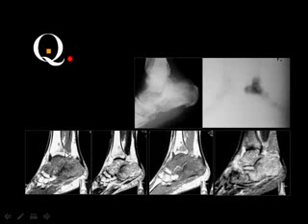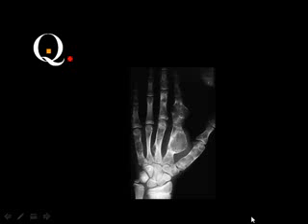Do you think this lesion has characteristic findings or non-characteristic findings? Can you say this is benign or malignant? Marrow infiltration means malignancy. And you got multiple bony affection: the calcaneus, the talus, and the distal part of the tibia. Marrow infiltration means malignancy, and this has been proved to be lymphoma by biopsy. The suggestion of lymphoma can be made from the plain X-ray by remembering that lymphoma produces some sclerotic reaction in the bone affected by the lymphoma.